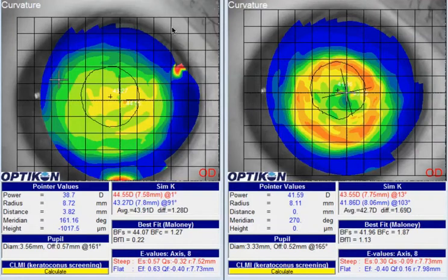In this orthokeratology case, we have a patient whose refraction is mostly cylindrical against the rule. We have an against the rule toric cornea, but I would make note that we've only got about half of that toricity on the cornea, so the patient's got 50% of the refractive astigmatism coming from the lens. And so really what we're looking to do is not to sphericalize or mold out cylinder in this cornea, but actually mold in just as much cylinder as currently exists, but in the opposite direction.